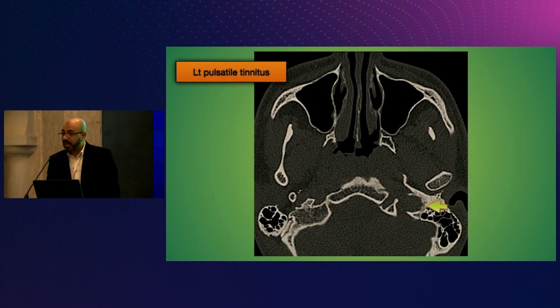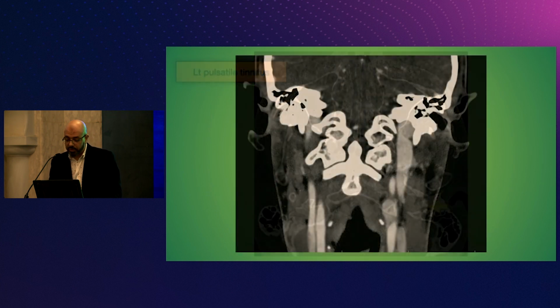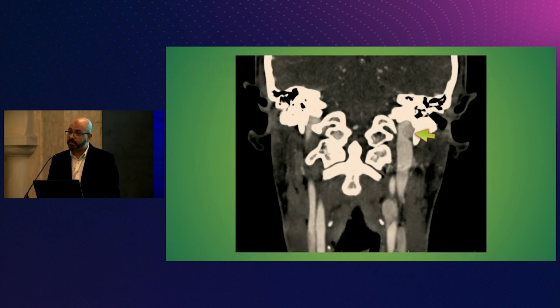We have erosions in the lateral aspect of the symptomatic side. So this is the jugular foramen. This is the typical appearance where a glomus jugulare starts laterally. And on the post-contrast, again, you can see the mass itself displacing the jugular bulb slightly medially. Okay, CT, it's an easy diagnosis to make.